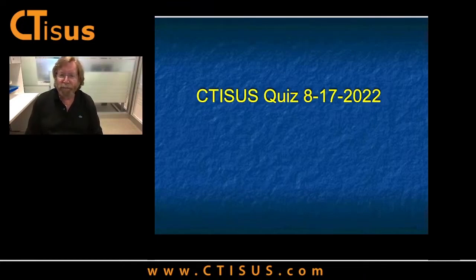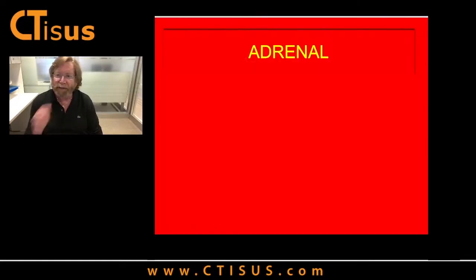So I have, I think, about a dozen cases or so. So without any ado, let's get started. The first couple cases, I'll make it easy for you. I'm telling you they're adrenal lesions.